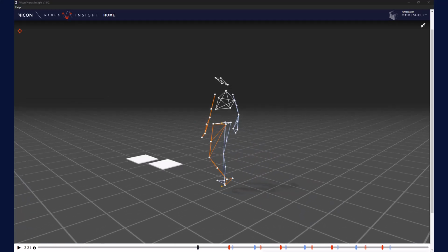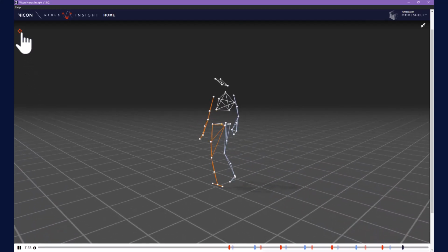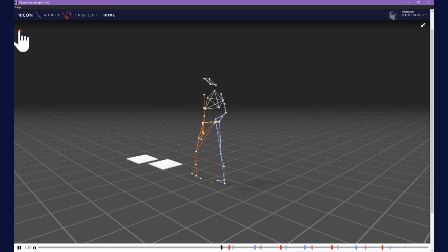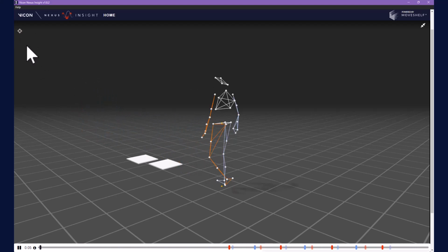With the thumbnail expanded in the 3D view playing, you can change the viewpoint focus by clicking the X icon on the top left of the screen. When the X is orange, the viewpoint will follow your subject as they move. When the X is gray, the viewpoint focus will change to be stationary.